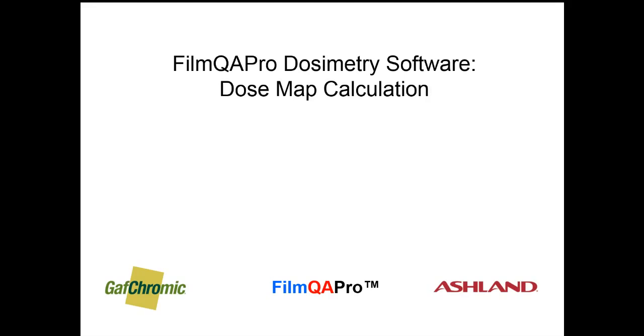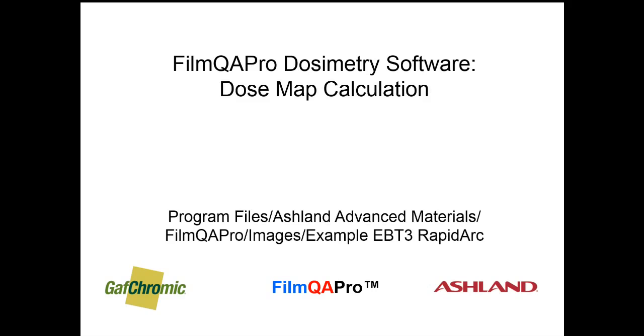Assuming you've completed the film calibration step, I'm going to show how to calculate a dose map using the EBT3 Rapid Arc example included in the FilmQAPro installation package. The route is shown on the screen.